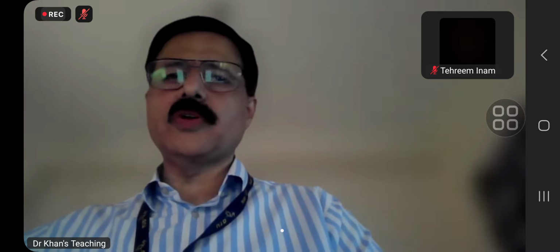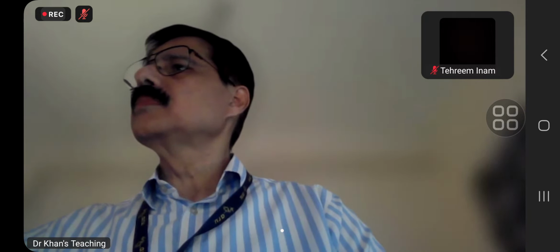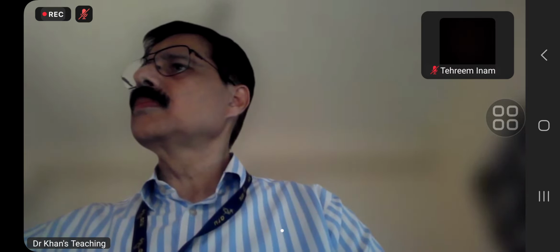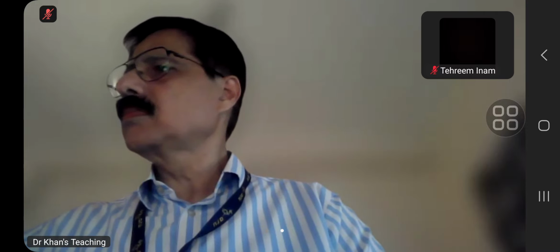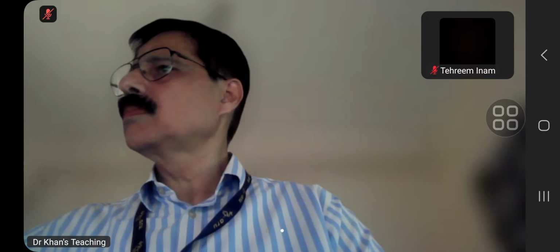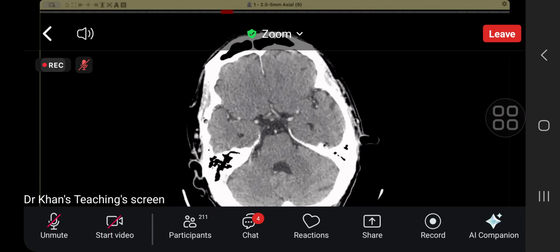Slight bit of delay in the software, just hold on for me. Candidate 1, can you see the case?